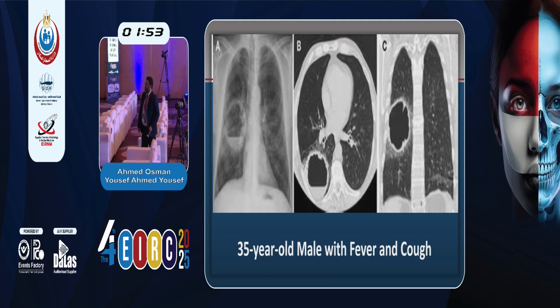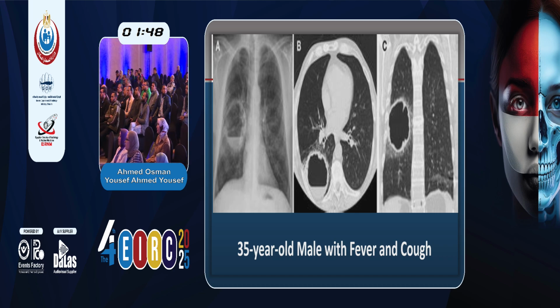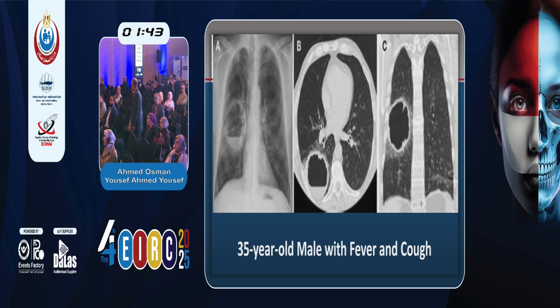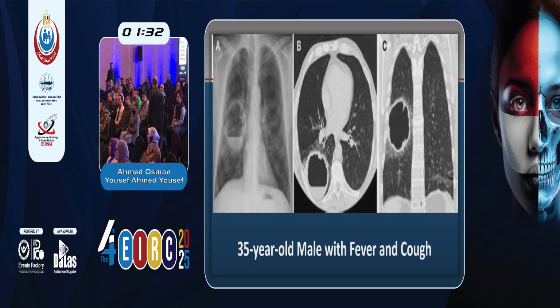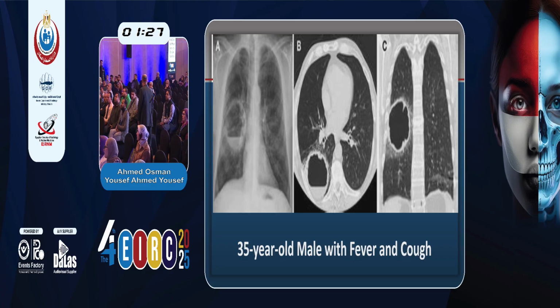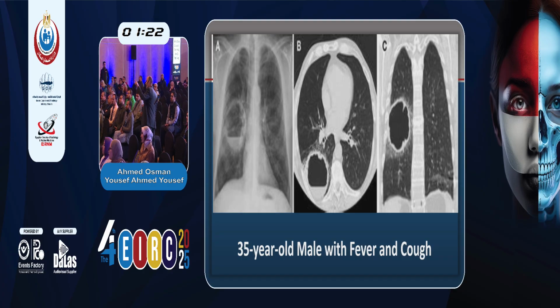Another patient, 35-year-old male with fever and cough. What do you see? Why did you say abscess? Right lung, yes. What do you see in the radiological appearance? Rounded cavity with air fluid level. Air fluid level, yes.